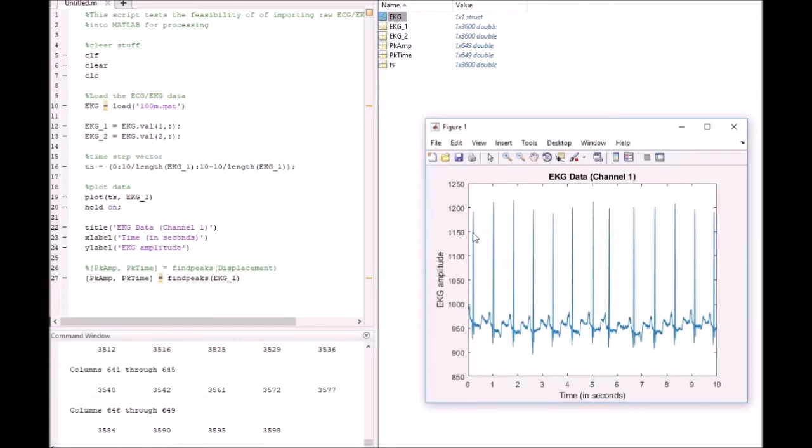We want the number of peaks on the QRS complex, the max peak on the QRS complex, which is right here. It's this big spike. It's the biggest electrical signal for the heart. And so what we want is to be able to count these.